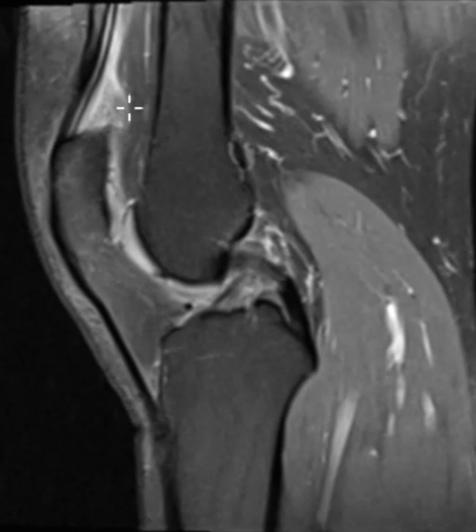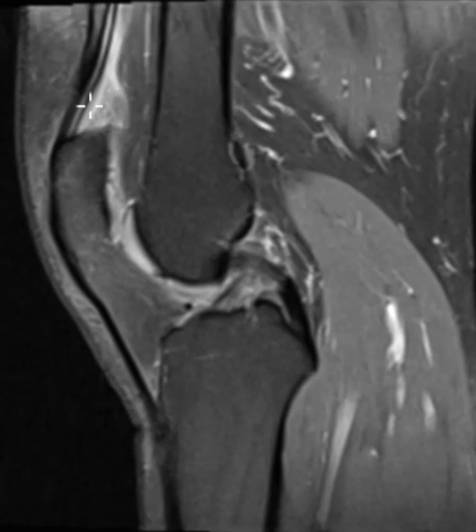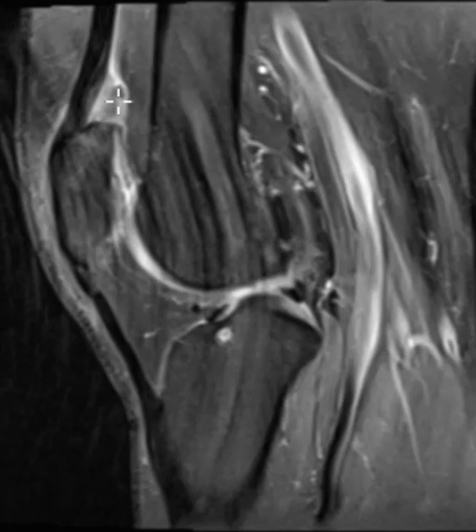This patient had anterior knee pain related to quadriceps fat pad impingement, just abnormal mechanics of stress. Pinch it, supposedly. It gets inflamed and enlarged and can cause pain, and that's it.